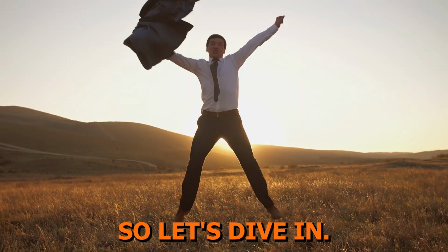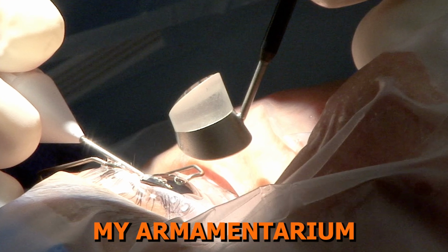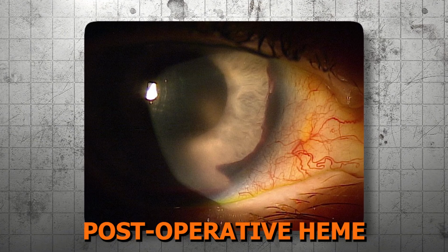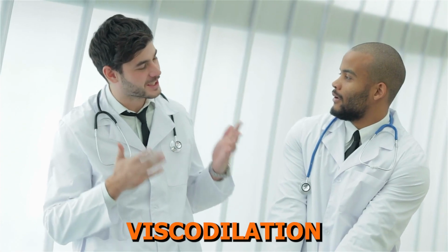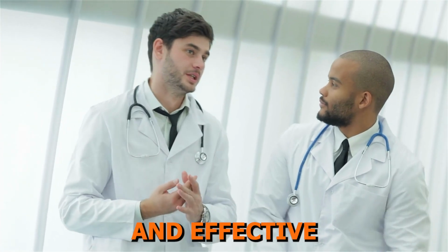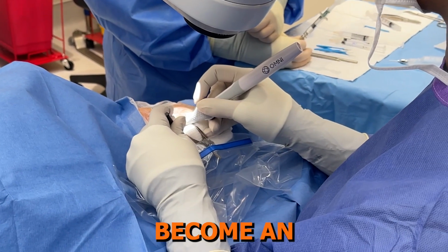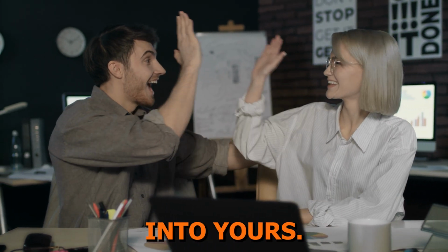So let's dive in. As an early MIGS adopter, I was eager to explore every new tool that could expand my armamentarium. My journey with canaloplasty began because I was seeking a technique that could address one challenge I was seeing in my practice: postoperative heme associated with goniotomy techniques. Colleagues shared their experiences with viscodilation, describing how for them it resulted in less bleeding, faster postoperative healing, and effective pressure-lowering outcomes. Intrigued, I decided to try it, and I found those advantages to be true in my patient population. Canaloplasty has since become an integral part of my surgical approach, and I'm excited to help you better understand how to incorporate it into yours.